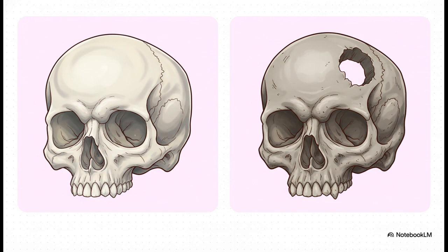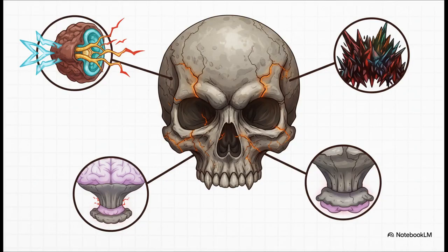If you see a thickened, bizarre-looking skull in a patient who is older, over 60, you have to be thinking Paget's disease. Paget has this classic early phase, the lytic phase, called osteolysis circumscripta, which looks like a big, clean hole in the skull before it gets all thick and sclerotic. And Paget's disease is no joke. It can cause some really serious problems.